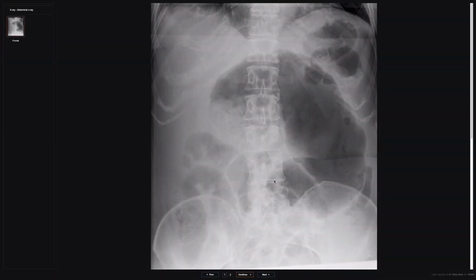So then the other one is cecal volvulus, which is this one. So you've got, again, a gas-filled distended viscus, not as large as with a sigmoid volvulus. And the thing to notice on this one is that you should have on the left side a normally located descending and sigmoid colon, which confirms for you that this is not sigmoid volvulus.